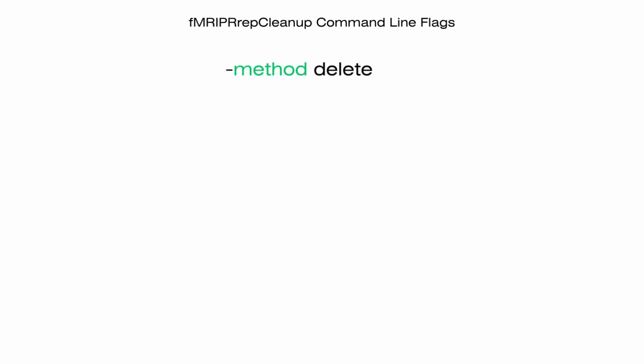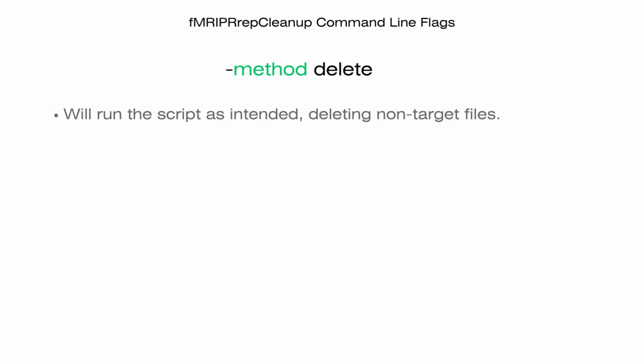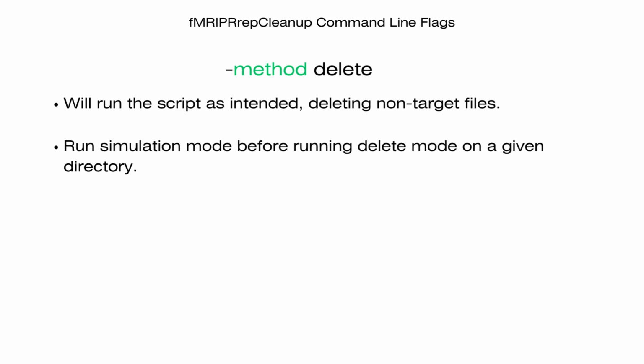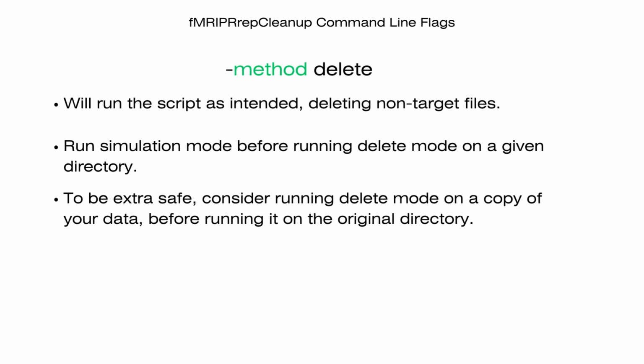Finally, method delete will run the script as intended and will delete non-target files in the directory you provided rather than generating new files, links, or folders. I highly recommend running one of the simulation modes on your data before proceeding with deletion mode. If you want to be extra safe, you can even try running deletion mode on a copy of your data before doing so on the original full directory.